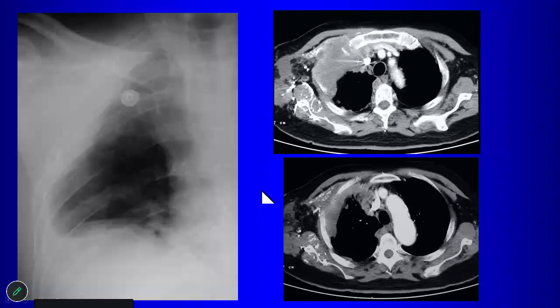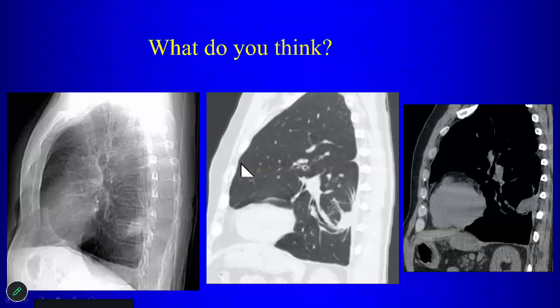This is mesothelioma. All right. Also, it involves the mediastinal pleural surface. So whenever you have pleural thickening that extends to the mediastinal pleural surface, you have to be thinking about malignancies, metastatic disease, or mesothelioma. So when it looks like the lung is small and you have pleural opacities going around the lung, the lung is encased with tumor. Okay. So here you got to worry about malignant mesothelioma or metastatic disease to the pleura that's encasing the lung.